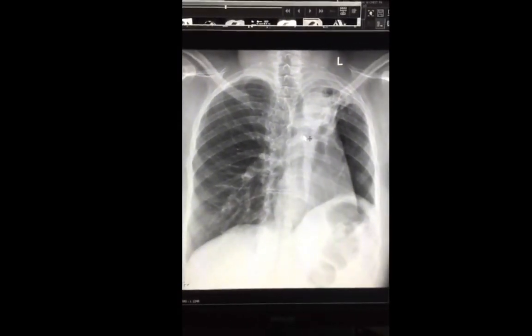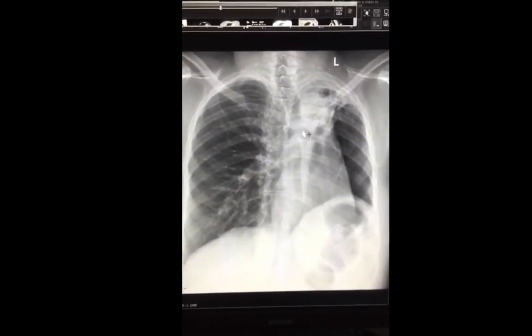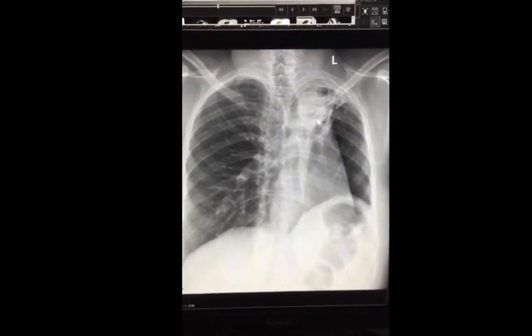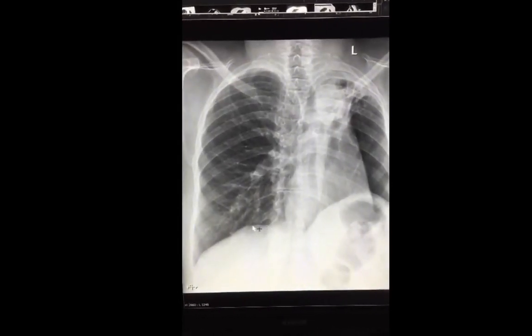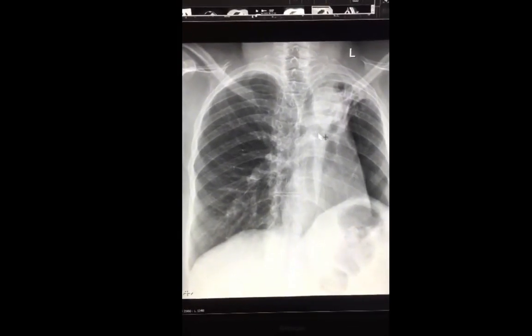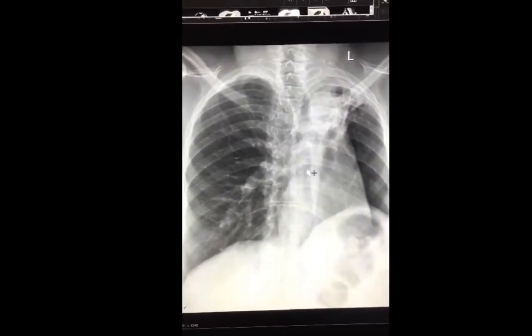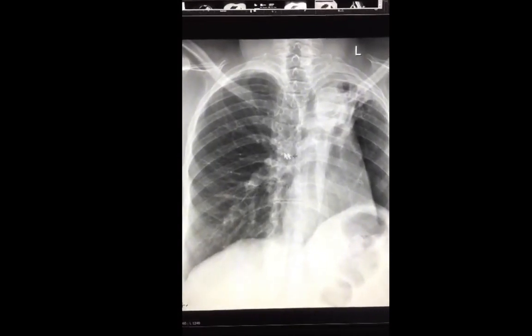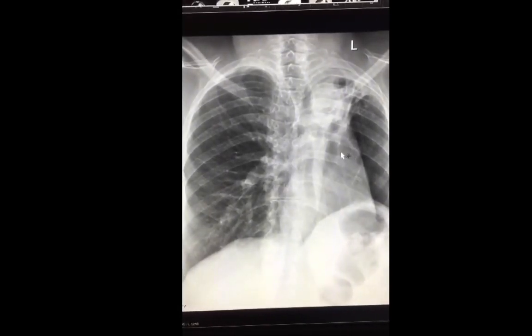It's difficult to compare the left and right hilum because of shift of structures. However, if you look at the airway, the left hilum is significantly elevated more than usual. More so, although we agree the right lung is larger, but this is significantly larger to what looks like a smaller than usual left lung. A neat observation is to see the differences between the intercostal spaces, and you can see how the ribs are more crowded here, leading to a smaller space on the left.